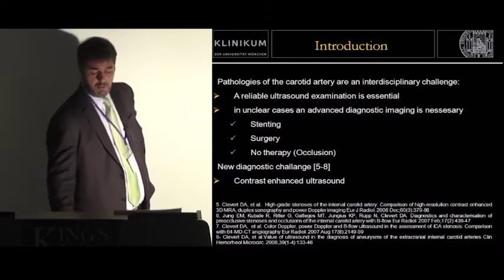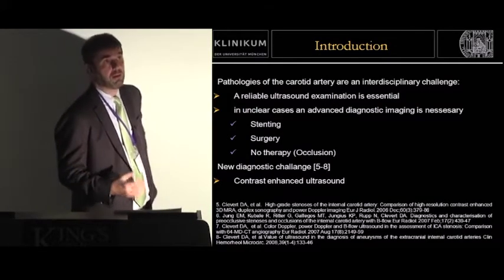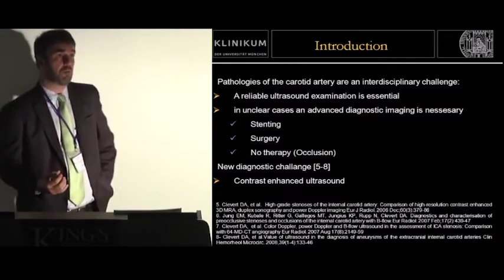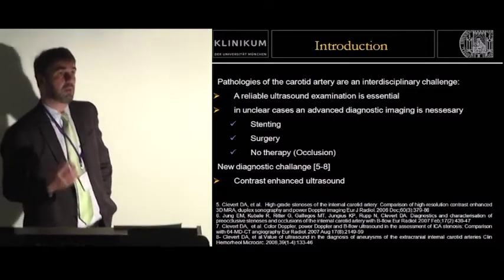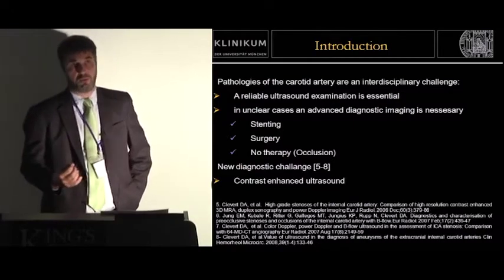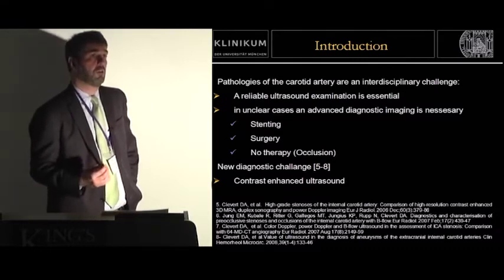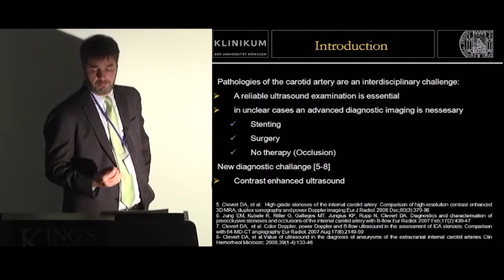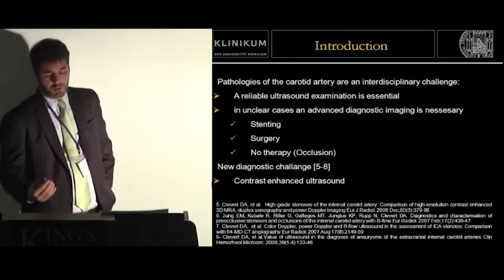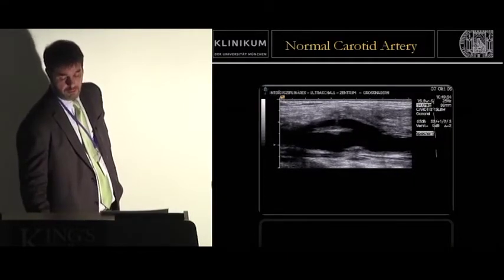So in this case, if you think about stenosis, we have to make a decision. Does this patient really have a stenosis? And we have to discuss it. What will be the best treatment? Should it be stenting, surgery, or, if there's an occlusion, no treatment? There are a couple of new options. The most used option in this case is contrast-enhanced ultrasound.